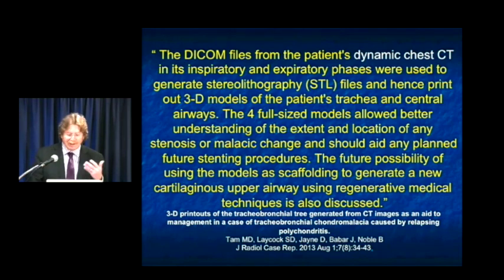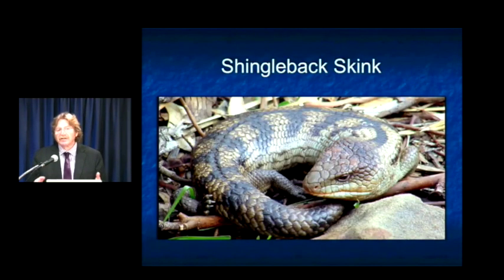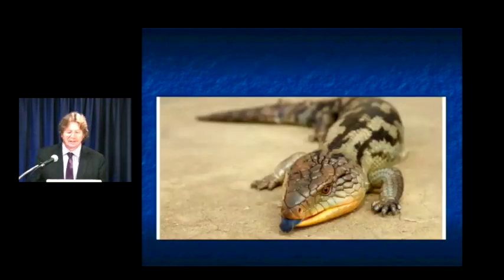You can see the quality. We've been looking at that, and I'll show you something we did. Here we scanned a lot of animals from the aquarium. This was a shingleback skink, or skink, probably more correctly said. And you can see how nice the animal looks.